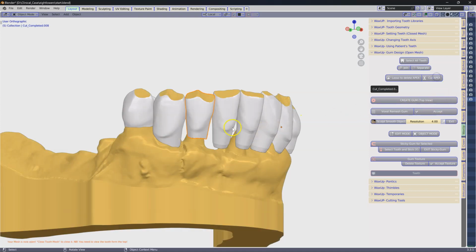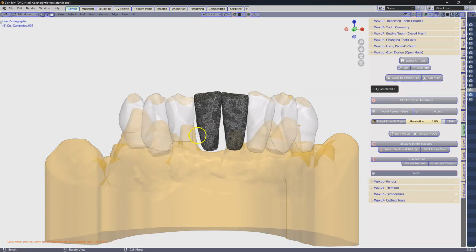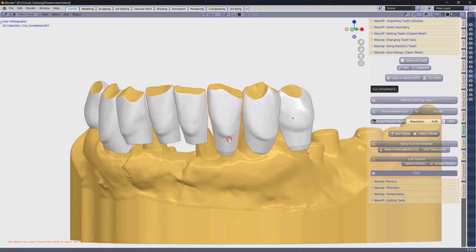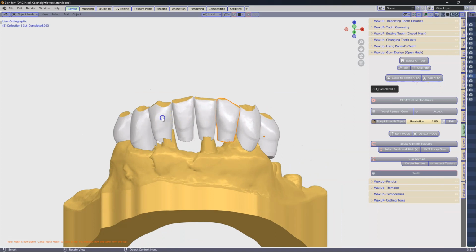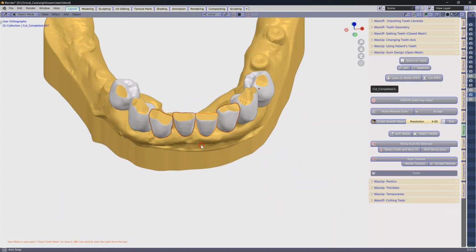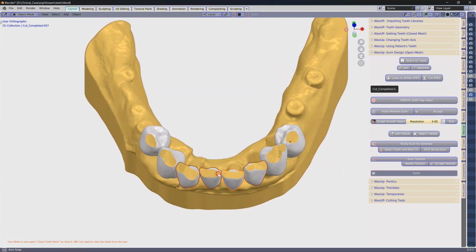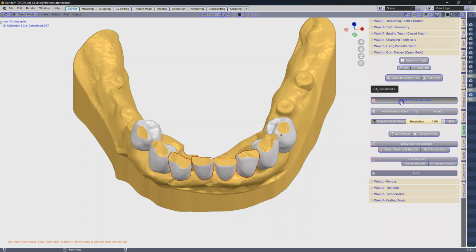Like this, cut. I'm going to go to the next one. We can maybe do 2 in one go. And finally this one. Then you need to select them, look at it from the top, and we want to extrude it. So we don't want to extrude it like that. We want to try and extrude it into the model if we can. Click on Create Gum.